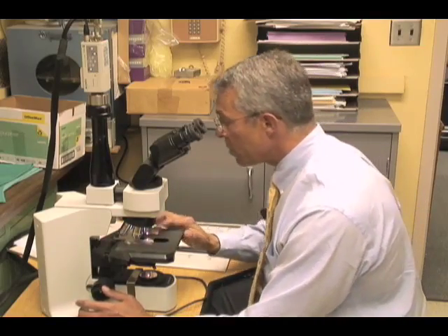As with all cases, there will be some samples received in your laboratory that are unsatisfactory, and we all have our threshold for unsatisfactory samples.